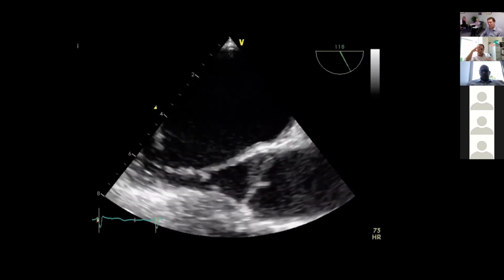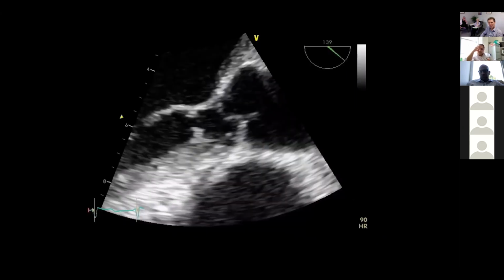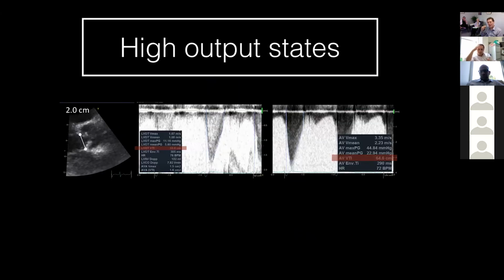Nice. How would you figure out the area? It would be better adjusted through the... So here it would be again the continuity equation, but placed across this particular subvalvular area. Let me flip the question around. Actually, I think I probably asked the question the wrong way. Let me try again with a different example, if I may, Hatem.